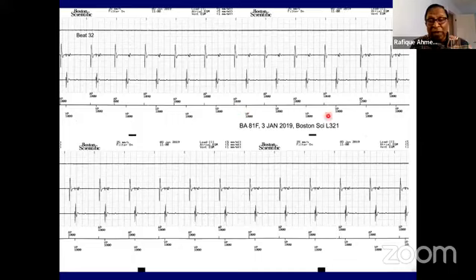And then after a while, it says, oh, I'm not seeing any ventricular conducted beat, so I'm going to make it short. And it is programmed in this way. And then after a little bit, again, it will search. Now, this feature, as I told you, should be programmed in places where you want to minimize ventricular pacing and you believe there is AV conduction. Otherwise, you don't want to program this feature.